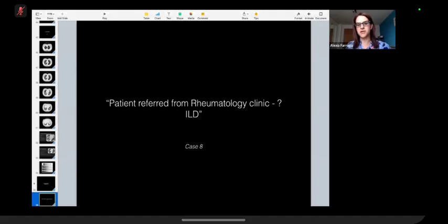So this is your history. It's a patient referred from the rheumatology clinic. Query ILD. Okay, so we will bring up the images for her.